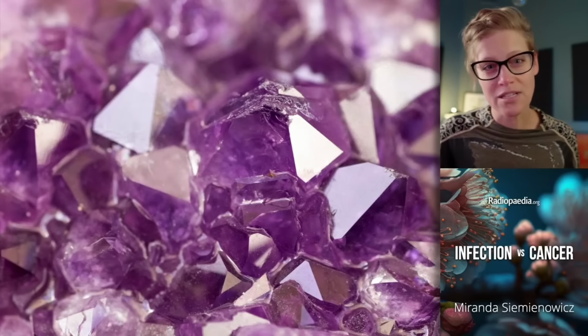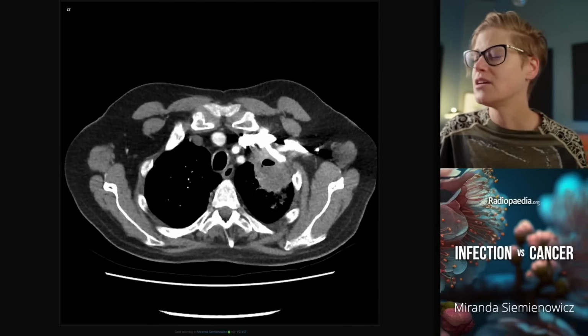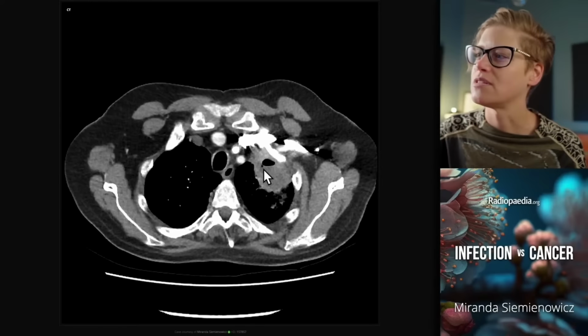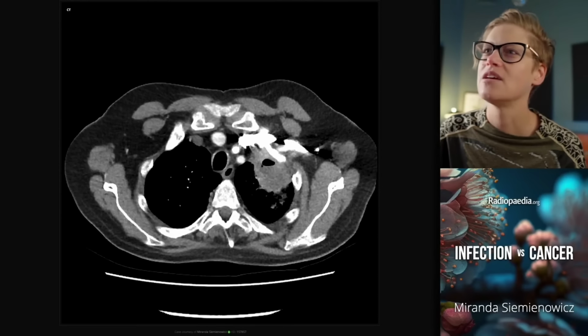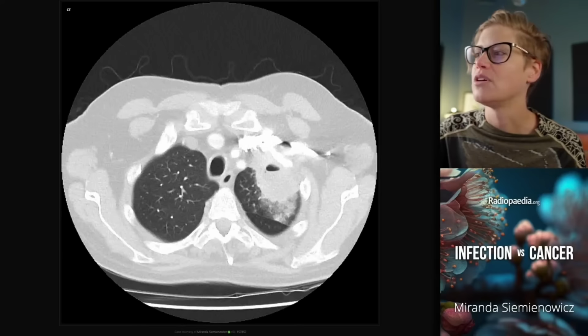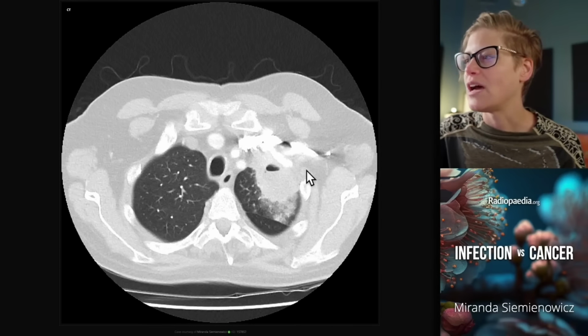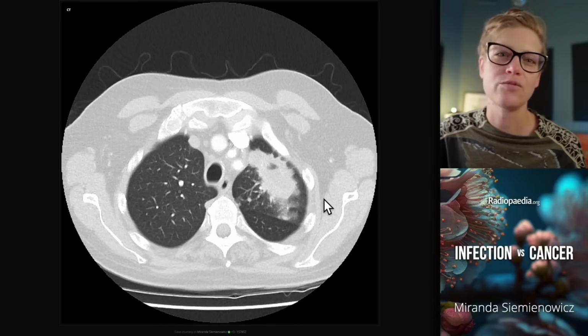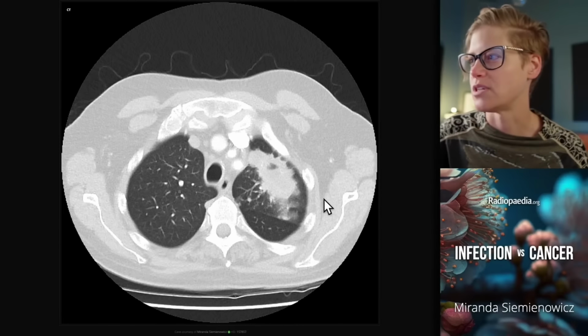So here we have a case where we've got a focal lung opacity in the left upper lobe. There's some heterogeneity in internal density, there's cavitation with a little locule of gas, and when we look on the lung windows, we're analysing that lesion margin to determine what is the morphology, what are the characteristics, and what are the clues to the underlying process.